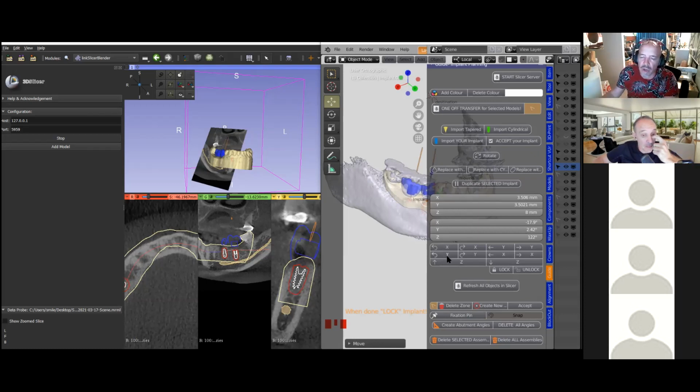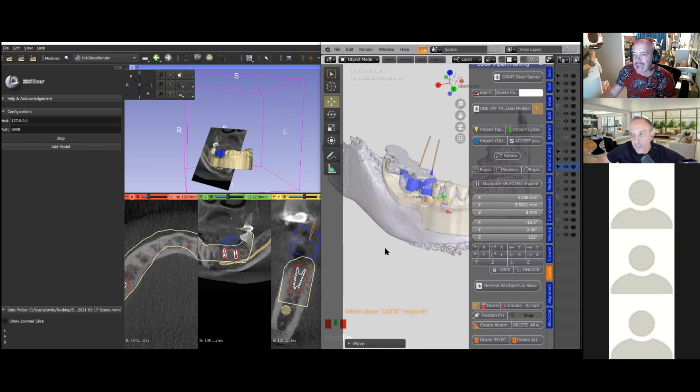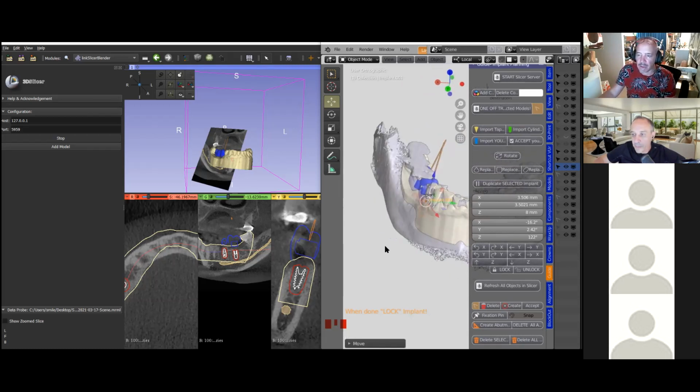So you can rotate it a little bit, this way or this way. You can fine tune it nicely. Okay, you're looking at the upper occlusal table as well while you're doing all of this. Yeah, we need to take that into consideration as well. But of course, you need the best implant site where it's going to integrate the best way. We can always add an angle if we wanted to. Okay, I won't get into the angle right now because we may just run out of time.